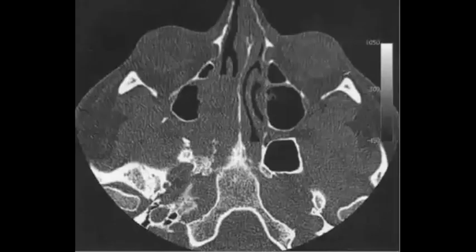The selected images of head and neck in this case, let's take it as the last case tonight. What do you think about this patient? How to describe it?